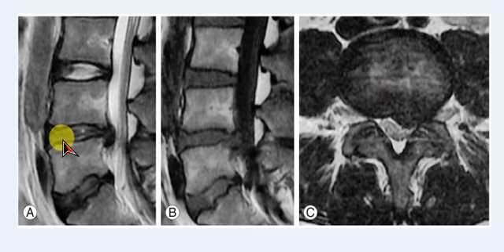So for example, let's take that this is the disc and its cross section is shown over here, and this is a very interesting image to see, because this posterior extrusion of the disc is pathological, and we need to find it out. Here you can see these are the margins of the disc, and this is the nuclear content, and you can clearly see that the nuclear content is protruded to the side.